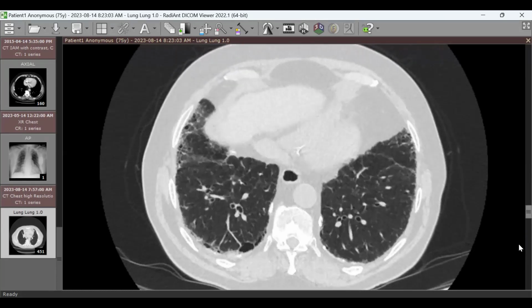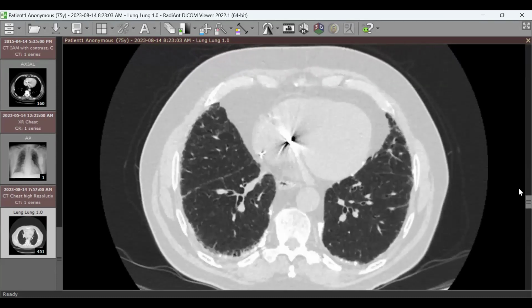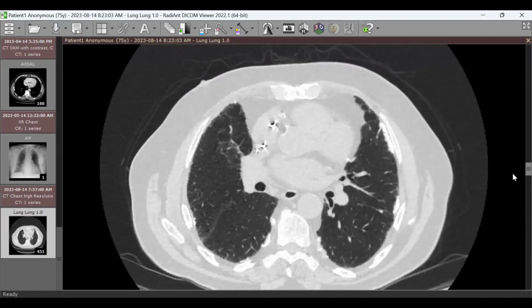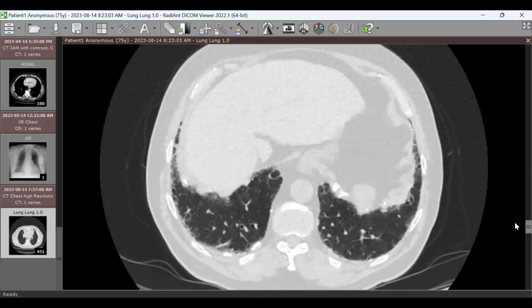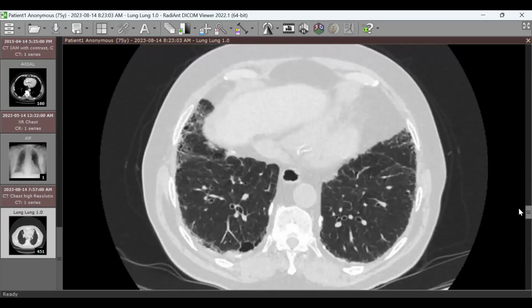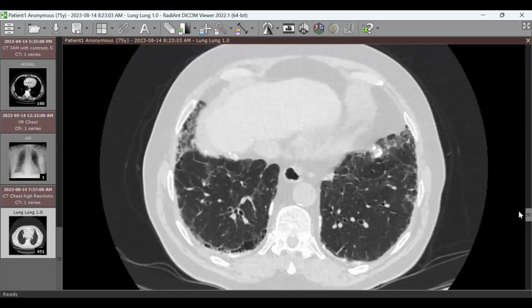So it is mostly an interstitial lung disease, could be related to the pleural plaques, may have an asbestos exposure or other. Yes, there's bilateral, peripheral, subpleural, predominantly basal reticulation with honeycombing, as we said here, in the middle lobe, lingula slightly, and also posteriorly in the right lower lobe. Honeycombing is the evidence of fibrosis. And traction bronchiectasis and bronchiectasis are evidence of fibrosis.